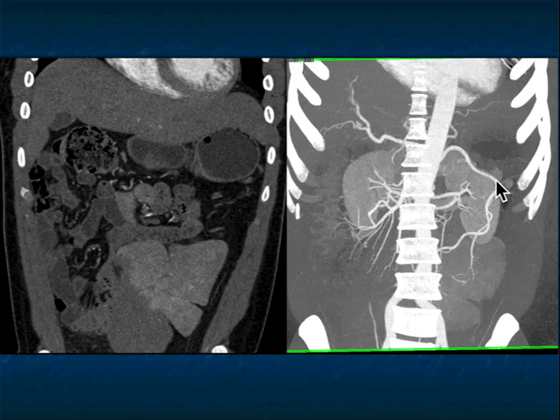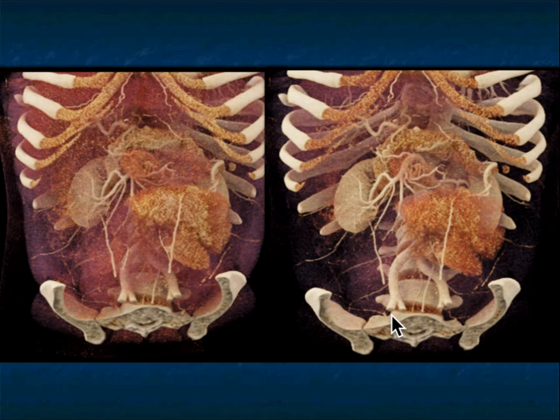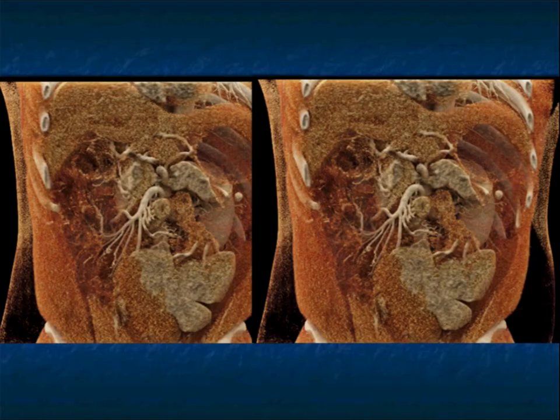There's the splenic artery. You see the splenic artery comes down, going with the spleen. And there's the spleen, right? Classic splenic shape, perfusion, and infarction. Just a beautiful example. Here it is with cinematic. So what you're seeing is a wandering spleen which twisted on its pedicle and infarcted half the spleen. This patient ended up with a splenectomy.